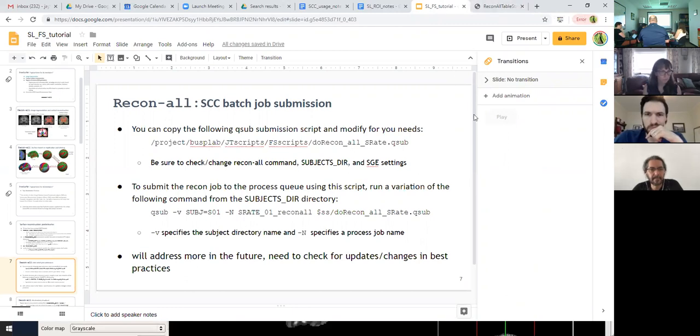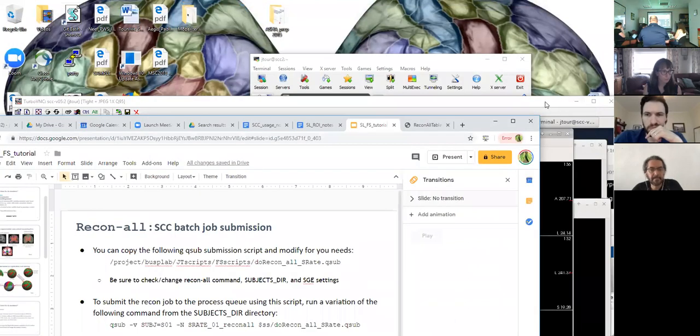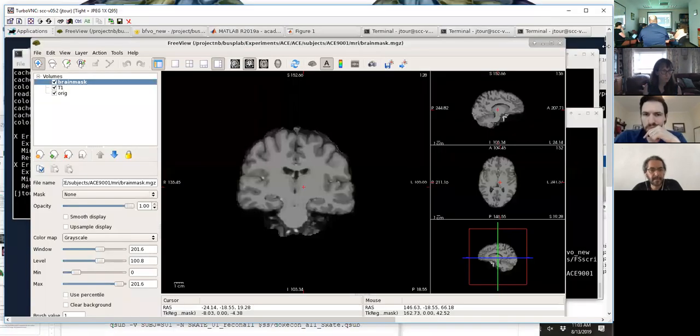Okay. So the reason I mentioned that there is that you can track what processes are done by looking at those steps and then going in and looking at what the individual functions do. Now, when you use the website like that, you click on the functions.